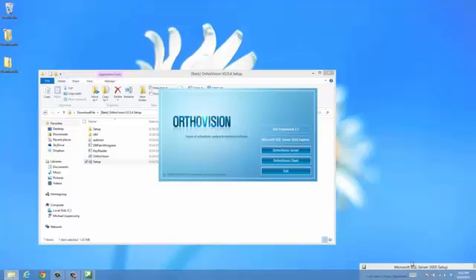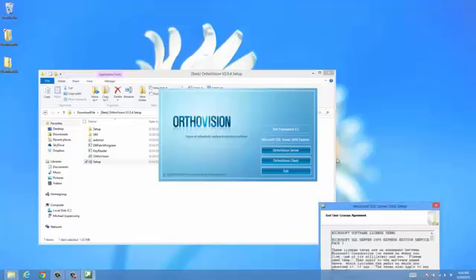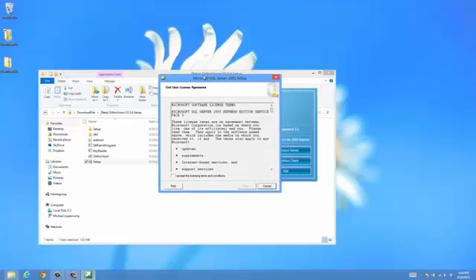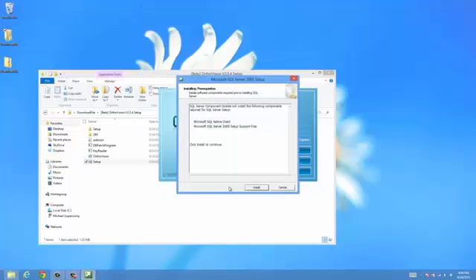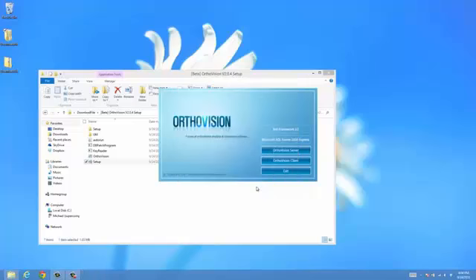Now, because I have Microsoft SQL Server already installed on this computer, I can't select it through the setup dialog, but I've had it already open, so I'll bring it up on the screen here and begin. As with most Microsoft setups, the first step before installation is agreeing to an end-user agreement, and then you can click on the installation button. We'll fast forward through the installation process here and move on to the next step.